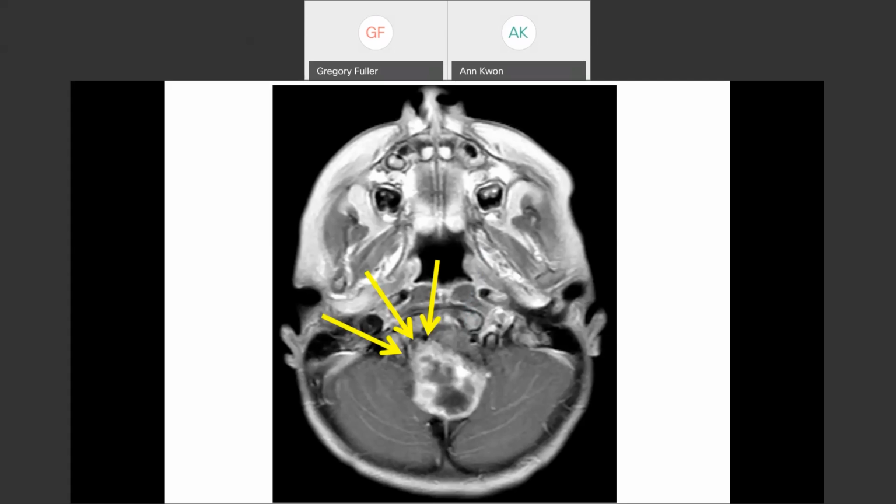Inferior cerebellar peduncles, close. But how would that help us? If it's a peduncle, this is the tumor growing out of the lateral foramen of Luschka. L, lateral foramen of Luschka. M, median foramen of Magendie. Or if you're Texan, Magendie. So the tumor is growing out through the lateral foramen of Luschka.